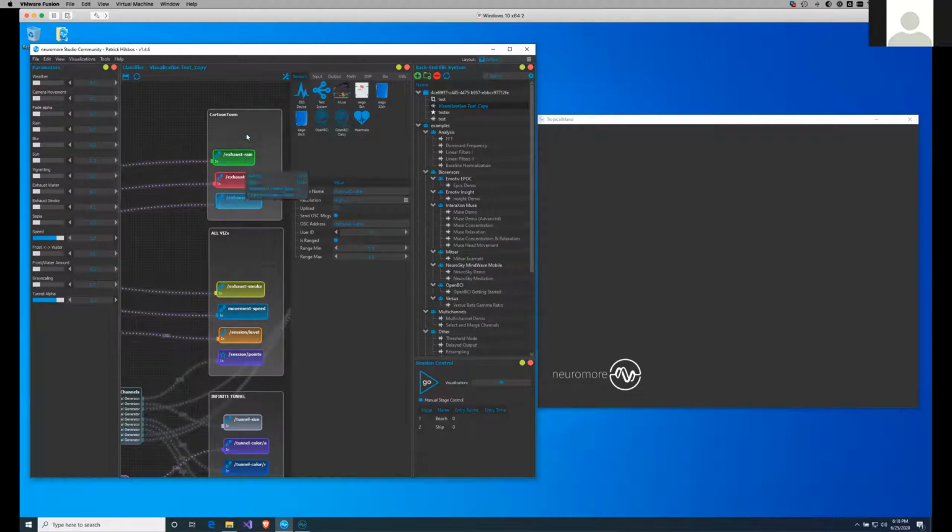You can change whatever you want, delete nodes, add nodes. And yeah, I just did that right now because I guess now you can read it better, because the grayed out thing most likely doesn't come out that great on that video conference.